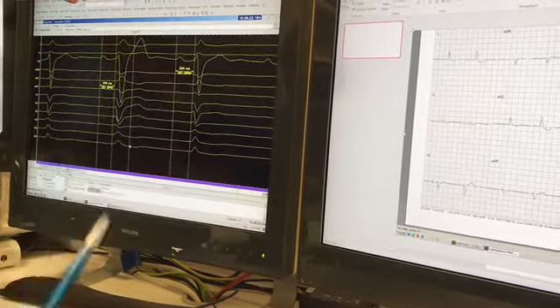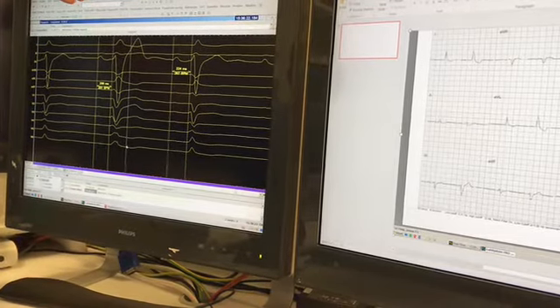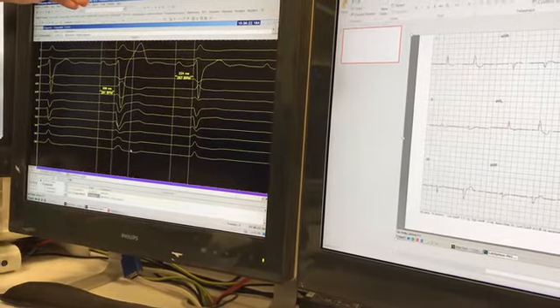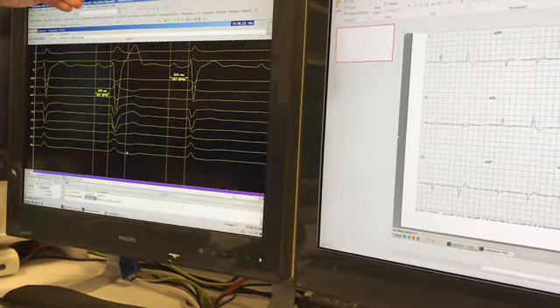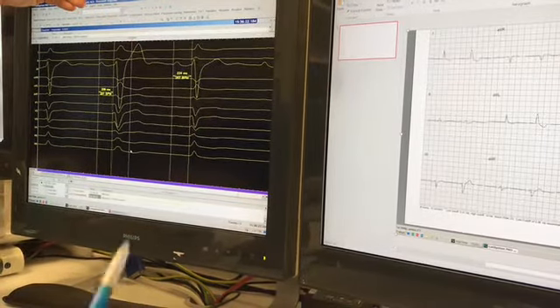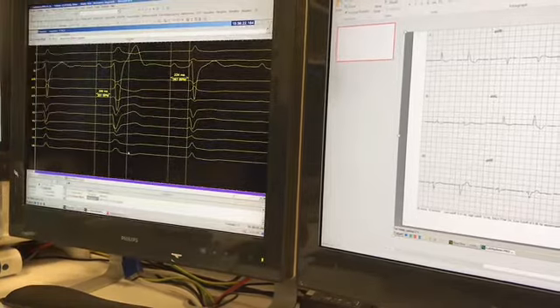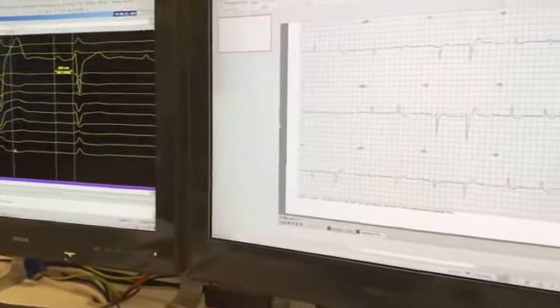And I'll explain to you what this means in a second and point out one of the very confusing things with an ECG post-TAVI that apparently shows a narrowing of the QRS with a resolution of left bundle, but with prolonging of the PR interval, which normally indicates trouble is ahead. So I'll ask you to now focus on this diagram.